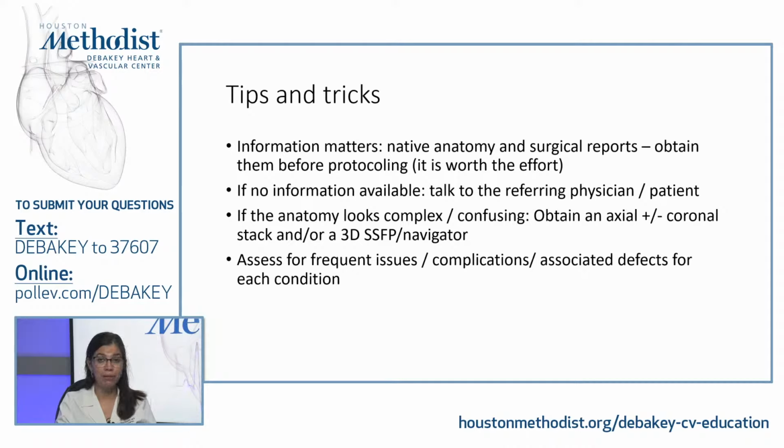If the anatomy looks complex or confusing, then it's frequently helpful to obtain axial stacks or coronal stacks. We also do a 3D SSFP navigator that provides us with a 3D image data set that we can post-process and analyze after.